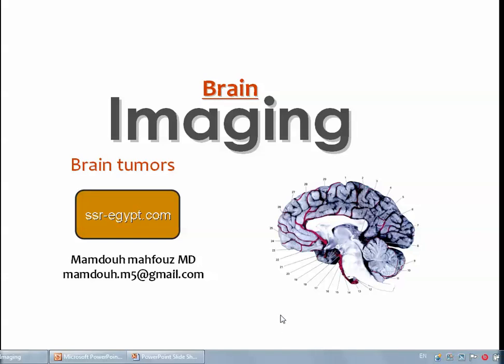Now we'll discuss the issue of brain tumors, and you know that this issue is very big and it contains a lot of names, a lot of diseases, and we'll try as much as we can to divide the brain tumors into categories so that we can deal with each category in a simple way.